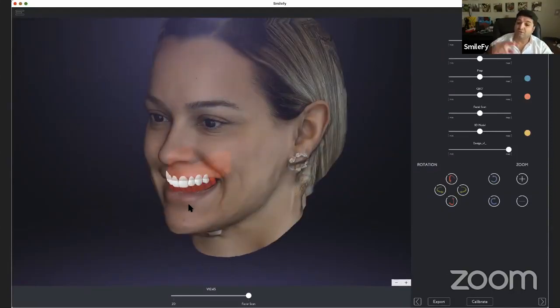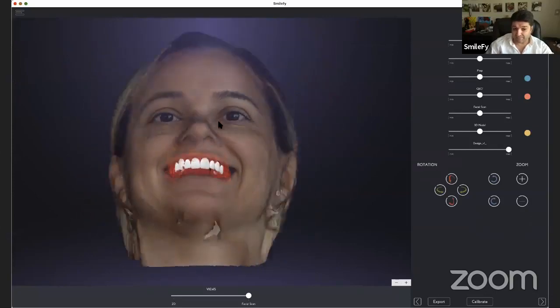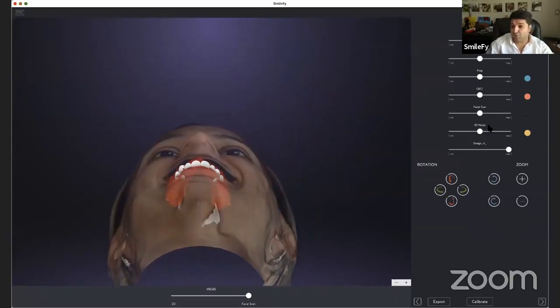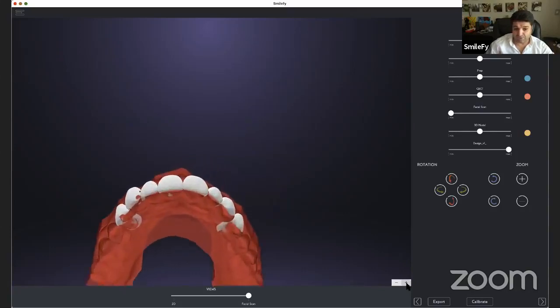Of course, you can do it the other way around also. You can let your lab or your lab technician create the design for you. You have the platform, you open the digital patient, you present your patient the design like this, right? You have beautiful ways also to explain more treatment options for your patient.